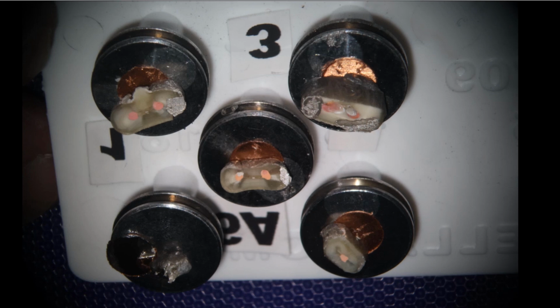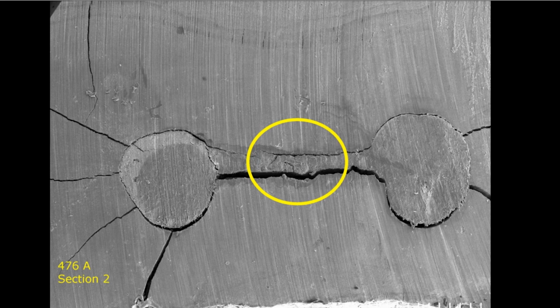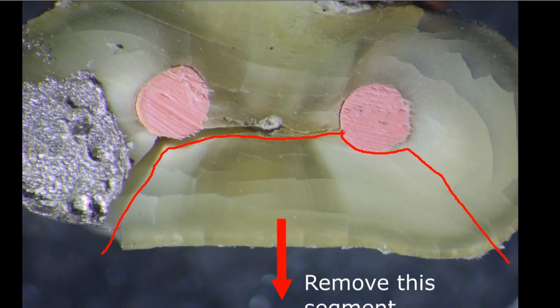These are the horizontal sections mounted on stubs before being sputter coated. We're going to focus our attention mostly on the interconnectors between the two canals. Under the SEM, this is what it looks like, and we're able to focus on some of the axial wall simply by going to very high magnification and examining the side of that. There you can see the side of the isthmus area, and we're going to look very carefully.